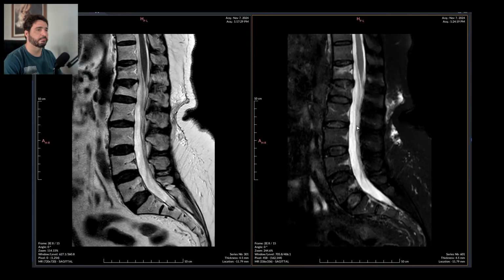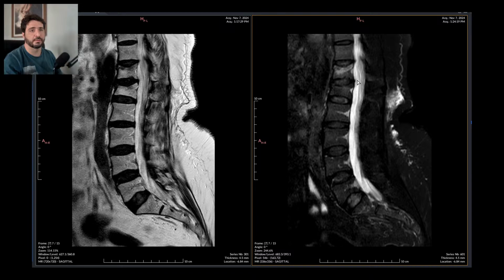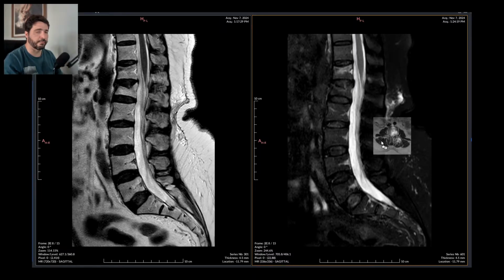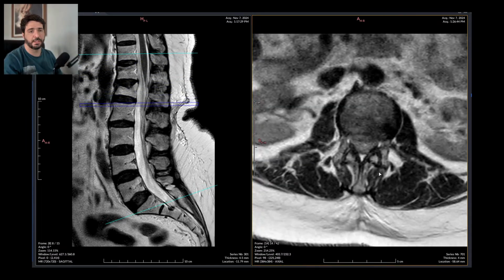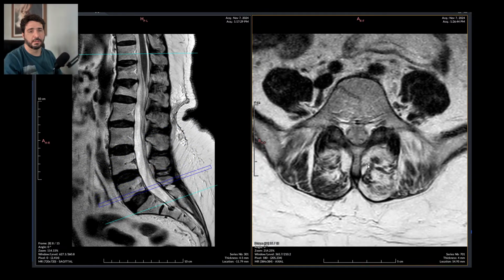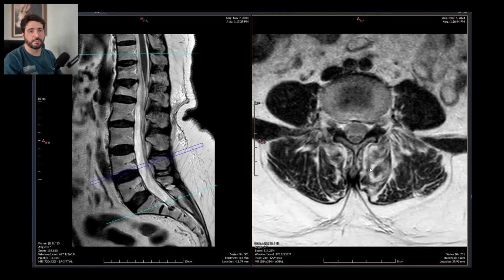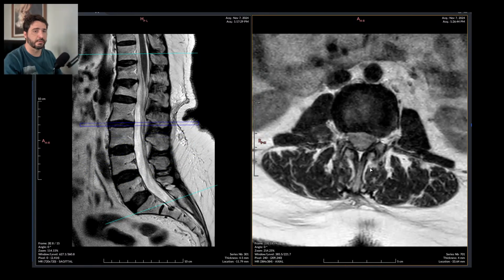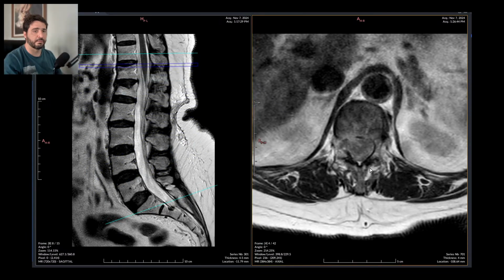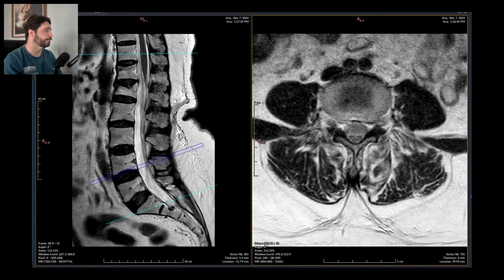I'll just refrain from saying much more than just a vertebral body fracture. This is also shaken and it's malpositioned. So this patient was clearly in pain. They tend to send patients to MRI without proper pain management. Go figure why, because the exam is really bad.